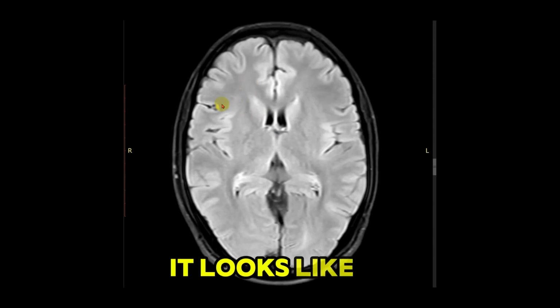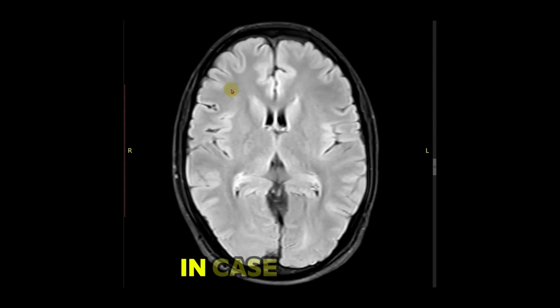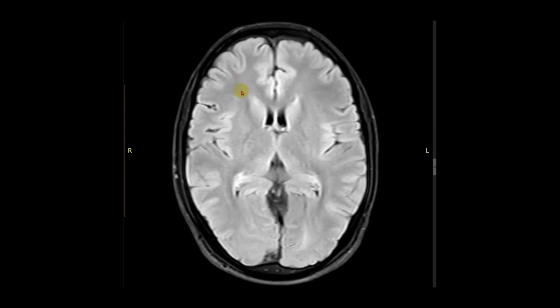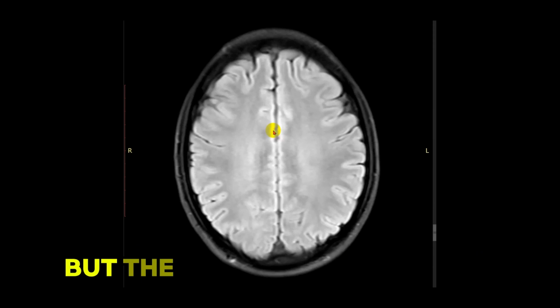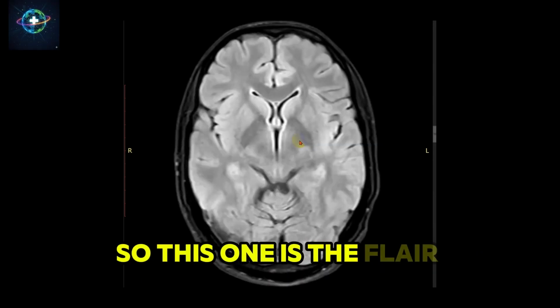It looks like T2. How can we understand that this is FLAIR? In case of T2-weighted, we have seen that the gray matter was hyperintense and the white matter is darker than the gray matter. So the parenchyma looks like the T2 sequence, but the CSF is signal void here. So this one is the FLAIR sequence.